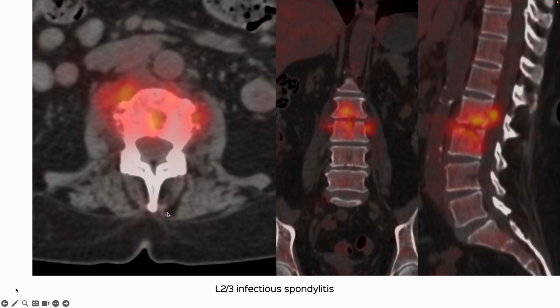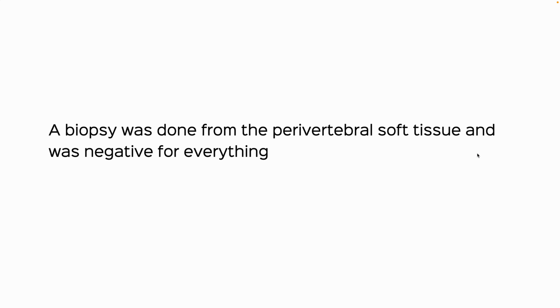I had this 61-year-old treated for carcinoma of the breast with backache, who had a PET CT about a week or 10 days ago. You can see these osteolytic lesions here with the abnormal soft tissue. It's a discovertebral lesion, so it's characteristic of an infectious spondylitis. A biopsy was done and was negative.